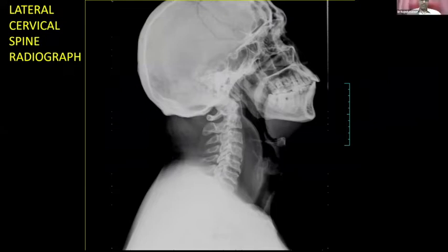Okay, so now when you have a lesion like this, when will you suspect an abscess, a prevertebral abscess? What are the things you have to look for? For an abscess, we might see air spaces within, an air fluid level, or the history can help. Now imaging wise, on X-ray, what are the things you have to look for when you are suspecting an abscess? Air fluid level is one, yeah, but usually rare. Now will you look for the cause?